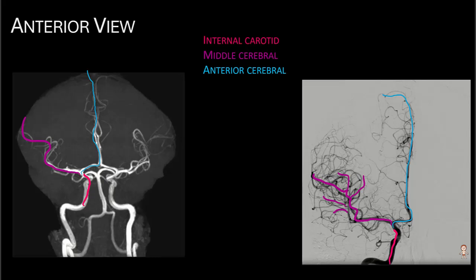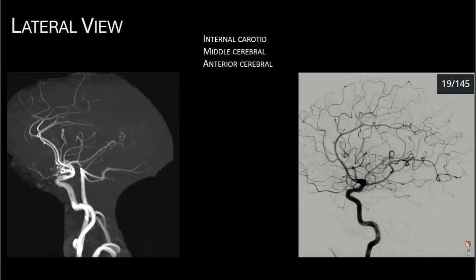We can see that it goes to the anterior cerebral in blue as it moves to the midline, up, and posterior, but we're not seeing the posterior aspect. We see it going up and crests over from the top of the brain, where the middle cerebral goes lateral towards the ears, and then it will spread out from there.